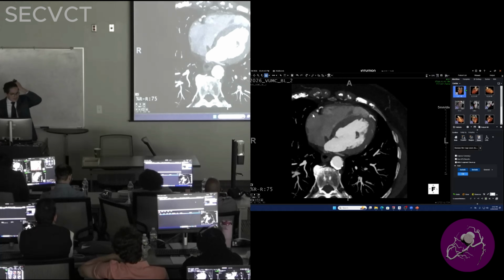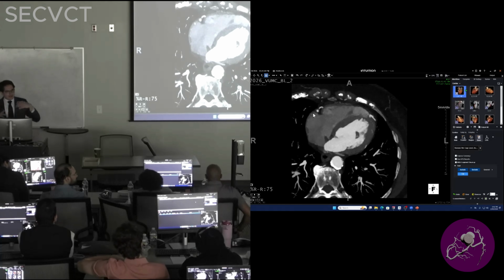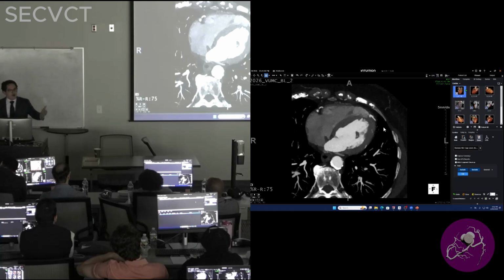Winkler, he's our chair for the cardiac CT boards, and some of us here make questions and everything. Not that this question will be on the board, but some of the things that we test is we show an image like this and ask, what's the dominance?